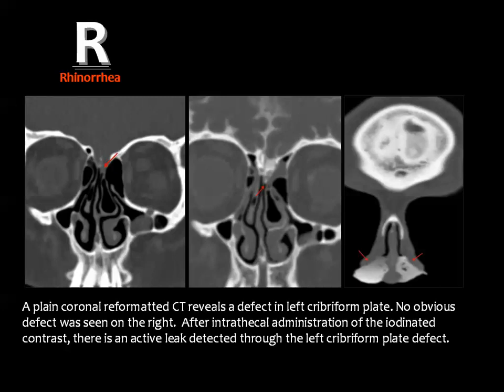And many times we used to put some cotton pledgets in the nasal fossa and look for their staining by the injected contrast material. This is one of the confirmatory findings if there is CSF rhinorrhea. And you know that rhinorrhea may be mistaken for allergic sinusitis, and you are not sure about the fluid coming from the nose if it represents the inflammatory sinus secretion or true CSF.